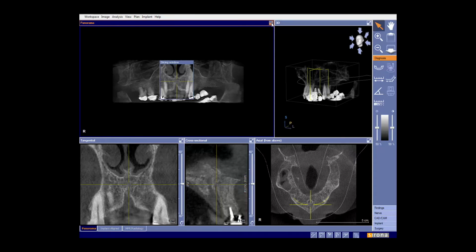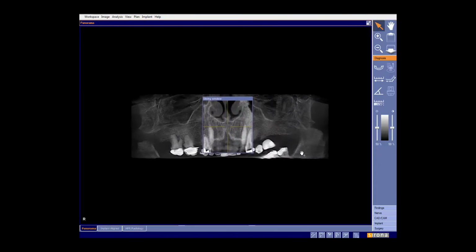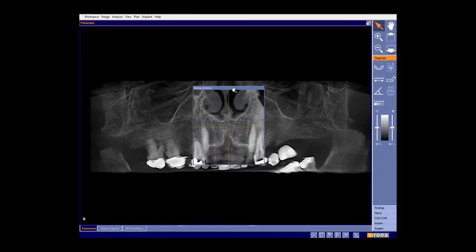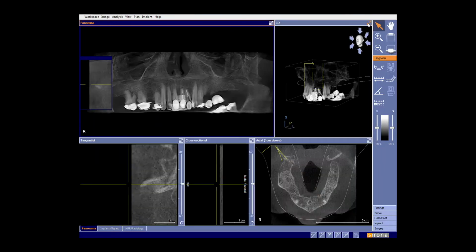Press save and it will reorientate the scans. I then enlarge the panoramic view, and with a right click and move of the mouse, I can enlarge this and have an initial view of the panoramic view to check for pathology and abnormalities. In this scan you can see several on the top right and top left hand side. There's also a socket on the top left. Incidentally, on this scan there are 2 false teeth top left to orientate for possible implant placement.